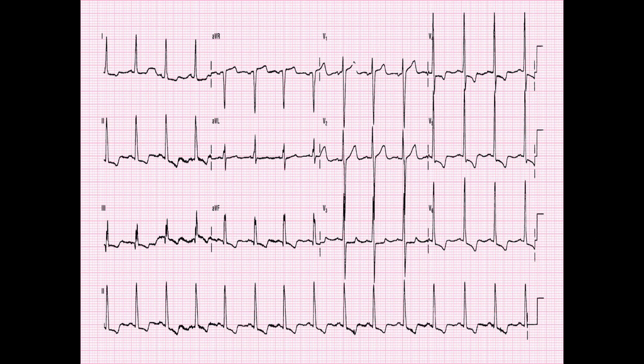And finally, in this EKG, again, ischemia, ST segment depression: lead 2, lead 3, AVF into V5, V6, V4, just everywhere. A little bit in V3, maybe a little bit in lead 1, right? But ST segment depression, we're going to be calling this ischemia.